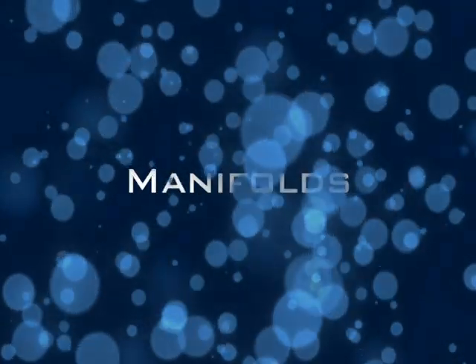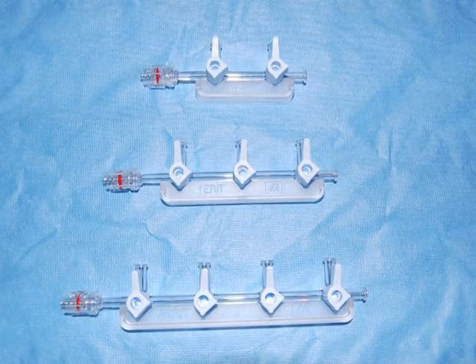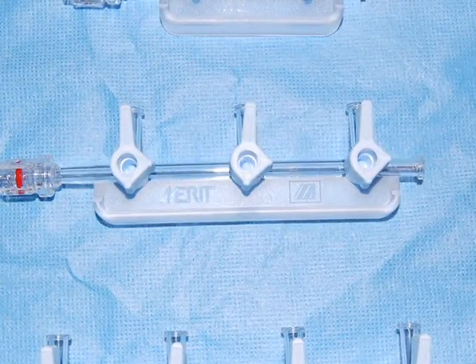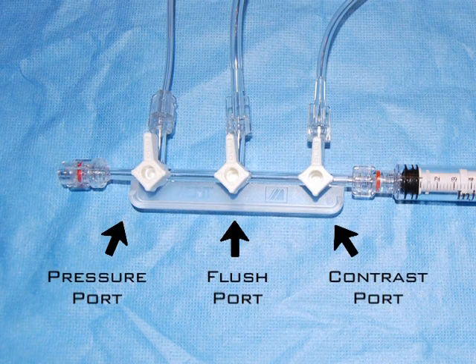Cardiac angiography is most commonly performed by manual injection through a cardiac manifold. These manifolds may have 2, 3, or 4 ports which are aligned by stopcocks, the handle of the stopcock indicating the off position. The 3 stopcocks most commonly used in a 3-port manifold contain the pressure port, the flush port, and the contrast port.